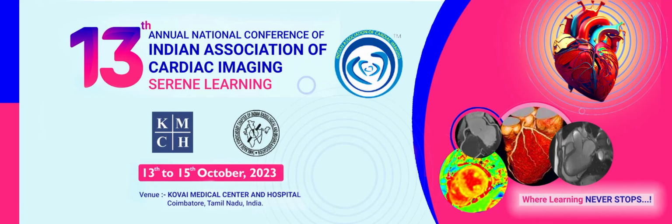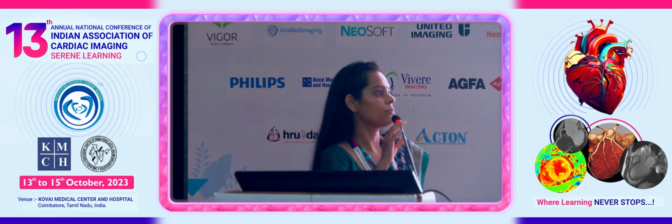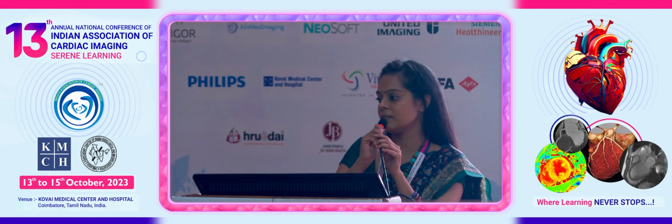Nice cases, Richa. Just so, you took all gated scans? Our cardiac protocol is one gated, one non-gated. Okay, so both.